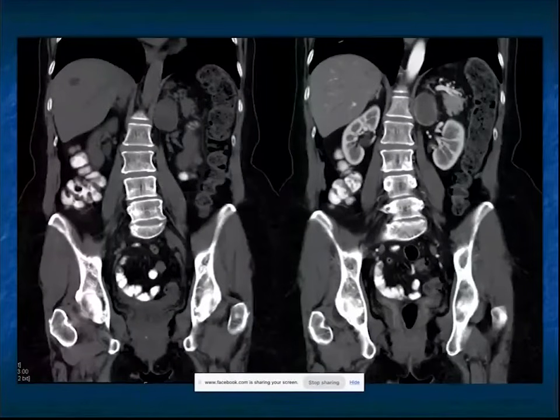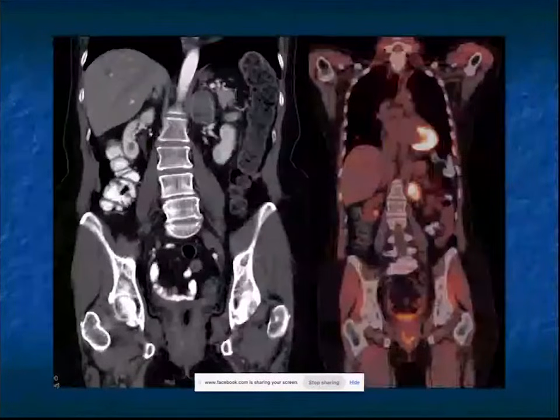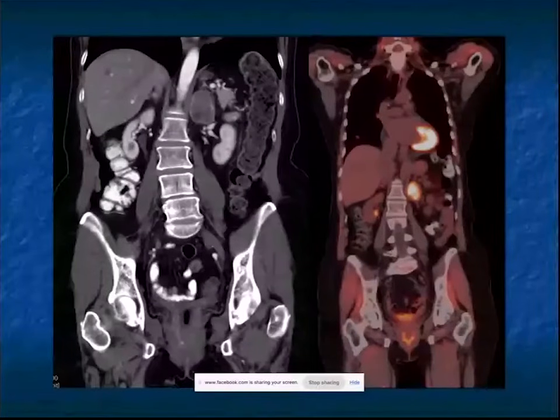So what am I thinking? I'm thinking, boy, this probably needs to be removed. I don't think it's an adrenal cortical carcinoma. If the patient had a history of malignancy, this could be a MET. You might think about things like melanoma. Doesn't look like lymphoma. And then on PET, it's hot. So a cystic lesion, prominent rim, low density, hot on PET. I got to be thinking malignancy, primary versus metastatic.